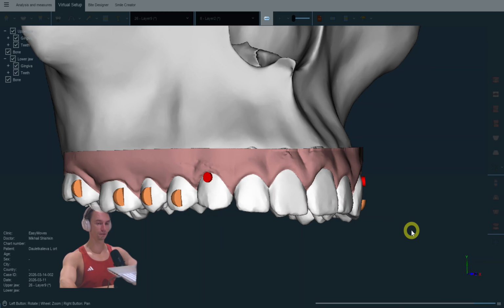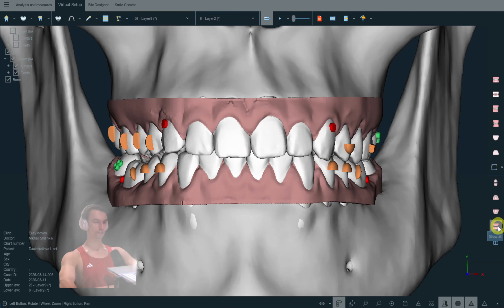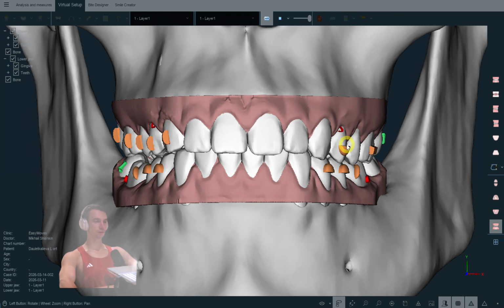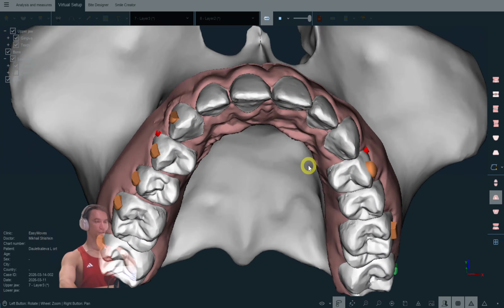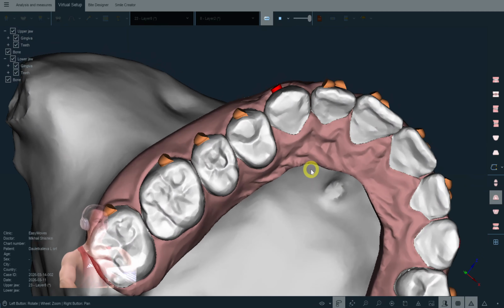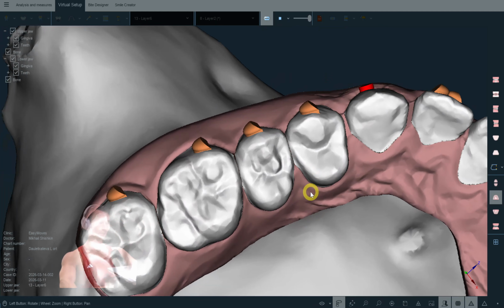And let's see the animation, how it looks. Then we're going to upload it into the cloud viewer and send it to the clients. Well, check out the animation. And very interesting, haven't I missed anything with these attachments?